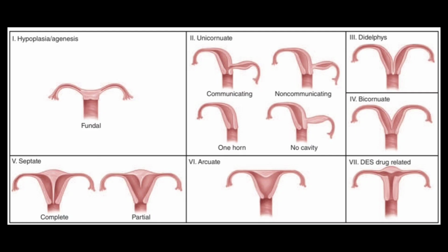On image 6, it is called an arcuate uterus. There is still much confusion, as some people consider it a congenital anomaly and some do not. But actually, there is a slight indentation of the fundus within the uterine cavity. In that case, the fundal thickness would be less than 1 centimeter, so that would be considered an arcuate uterus. On hysterosalpingography you can also detect that. On ultrasound this may not be easily picked up, but on hysterosalpingography and MRI scanning these anomalies can easily be picked up.